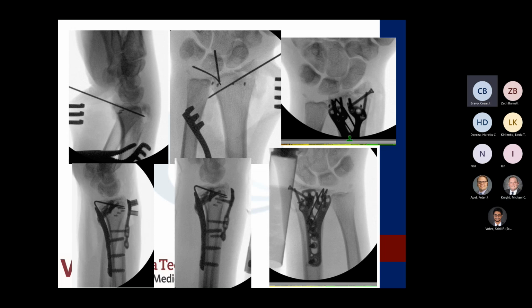We put the X-fix because it was already settled volarly, so it was already contracted, and he's fairly young. So for those, even if we get good fixation, they tend to want to contract back. So I take that factor out, and that's why I put the X-fix. And we did have an ulnar column plate from the TriMed. We ordered that before, so I kind of super planned for this.